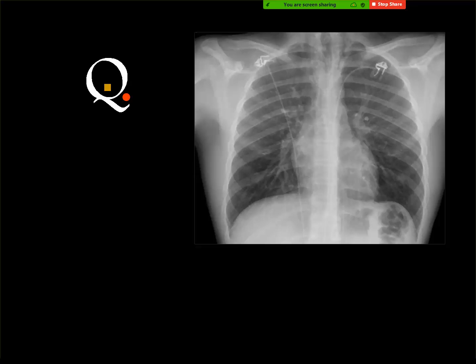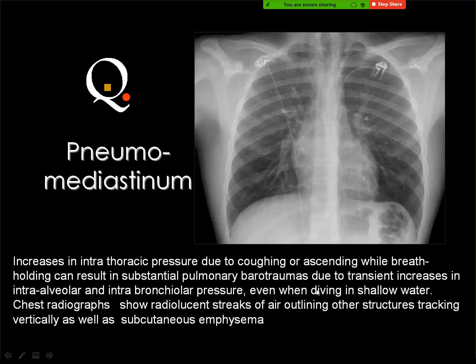Surgical emphysema in the neck, beside the trachea, double trachea sign. Whenever you see these lines of air in the neck, you always think of pneumomediastinum. Then you look for the other sign, which is the continuous diaphragm sign, because you cannot see air actually in the mediastinum because of the adjacent lung. But if you want to diagnose pneumomediastinum easily, look at the neck of the patient. If you see linear air shadows alongside the trachea, then you should think of pneumomediastinum.